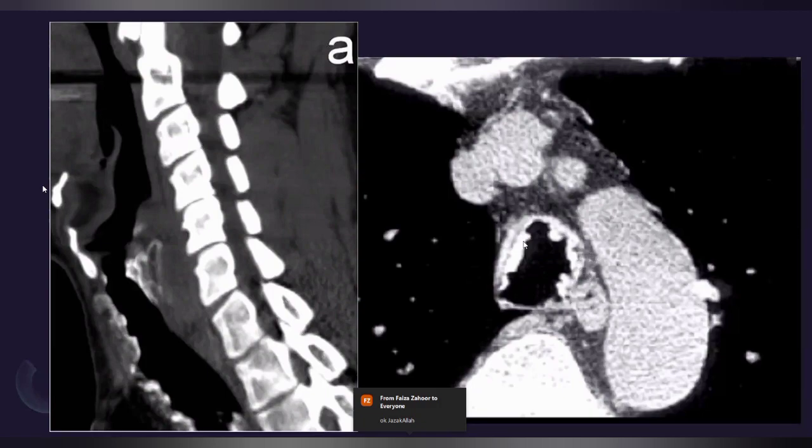One thing, sorry, just let me direct you. These are denser than the vessel itself. So these are basically calcification, and I'm not even sure whether it was a contrast examination or not. Any other differential? Tracheomalacic changes, irregularity in the cartilage of the trachea. Because there's quite disruption, basically these are calcification.